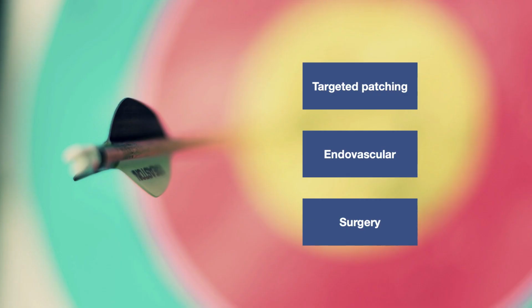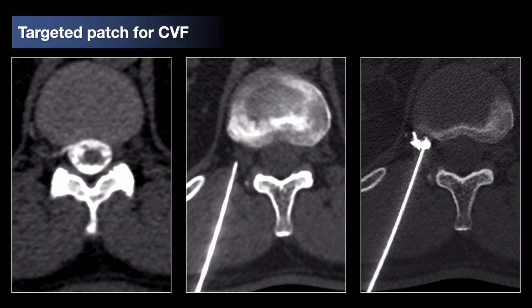And treating the direct leak site, so targeted treatment, requires leak localization methods, and that is from those myelographic strategies we discussed. And the radiologist has a role in management of several of these, mainly in image-guided patching. And this has the advantage that it's minimally invasive, they're day case procedures that are done under local anesthetic, and they generally have a low risk profile compared with open spinal surgery. So I tend to perform our targeted patching under CT guidance.